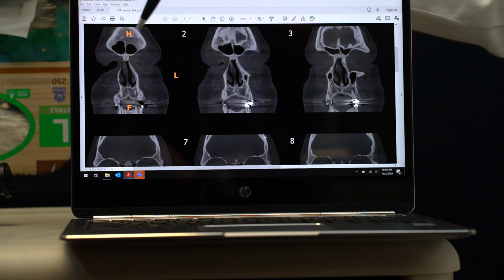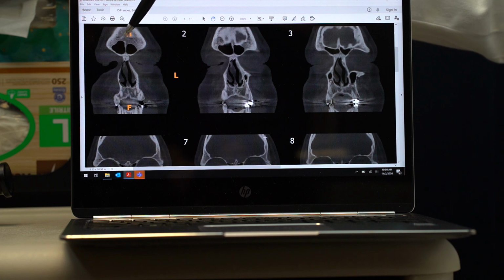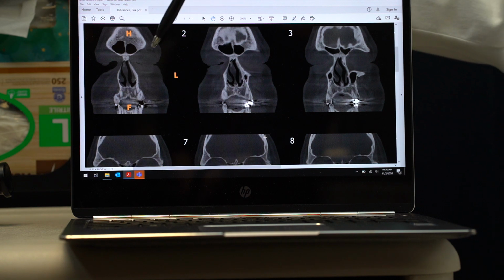Now there's white here, that's this patient's forehead, but then there are these black areas here and here. Black is air, and so when we see these areas, those are the sinuses in the forehead, and those sinuses on this CT scan are generally looking okay. Here is the nose, and that's the inside of the nose. The gray structure, that line going straight up and down, is the septum. The septum divides the nose into 2 sides, left side and right side.